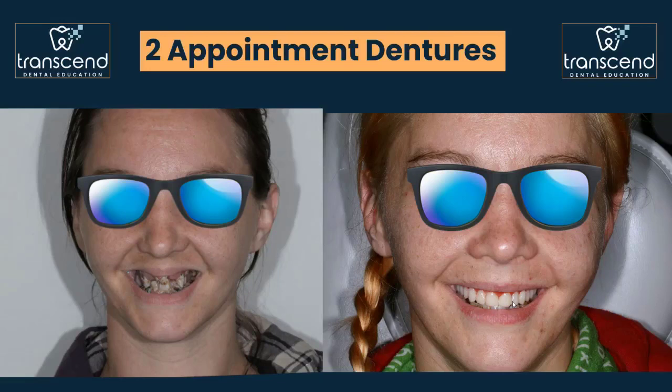That's all you need. And then from a software perspective, you need Blue Sky Plan, which is free to download, and you're only charged basically a per-case fee on your exports. So hypothetically, let's say we did an upper and a lower denture. That's going to cost me one export at 20 bucks. And then just to use round numbers, let's say that each denture cost me $10. So $40 to do this and 2 appointments, 2 quick appointments, I'll add.